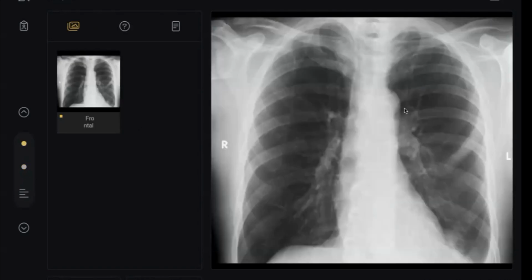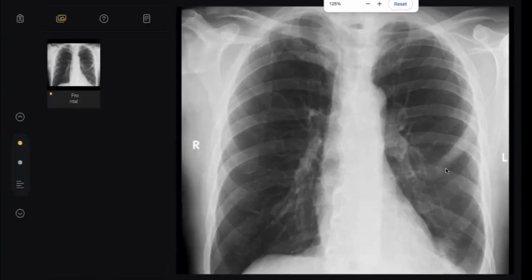See, my colleagues, if you see the lung looks normal, don't waste time. Search immediately in the review areas. And when you are searching in the review areas, my advice for you is to compare. If our doctor is one example of all of us, and we were presented with this case, we would miss this one.